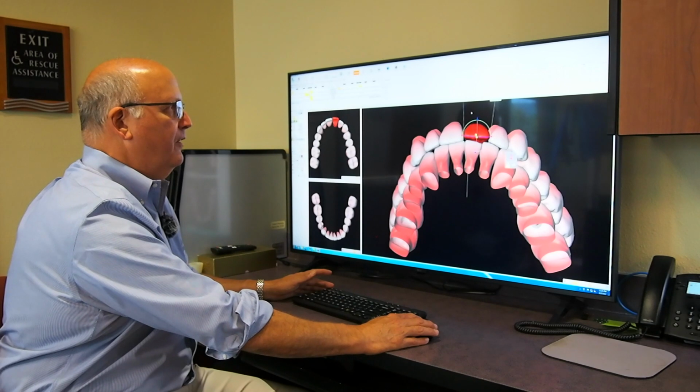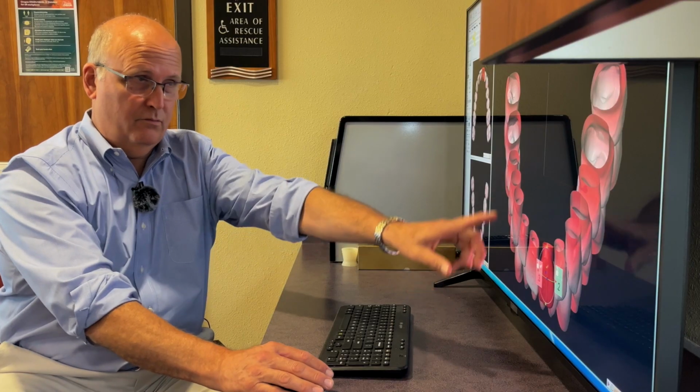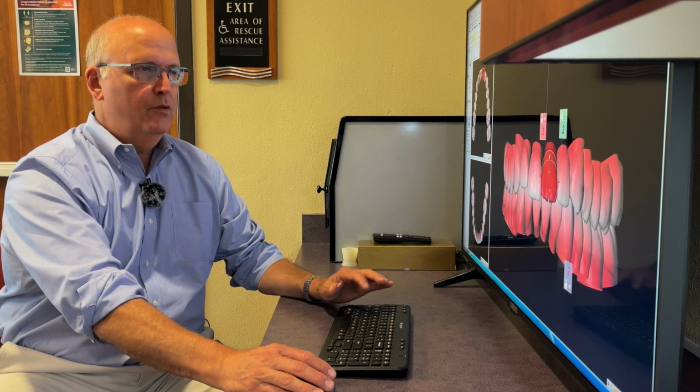Additionally, you have to keep in mind how this tooth, and what you don't see is the projection of this root, actually relate to the bony surrounding. But through this process of tooth manipulation, we can create a treatment plan that will move a tooth in a desired direction.